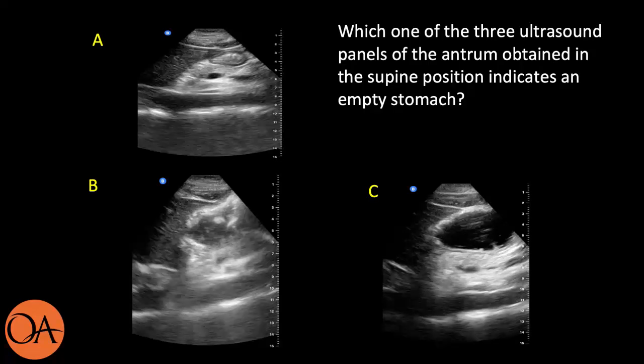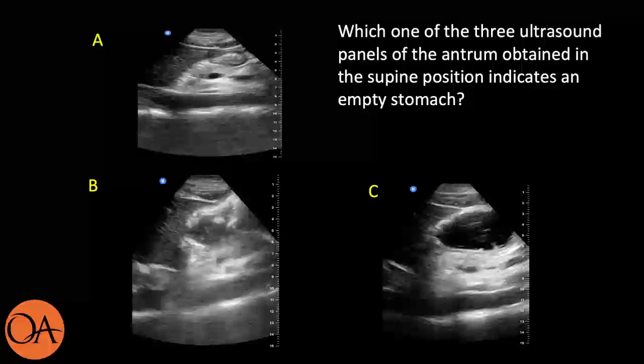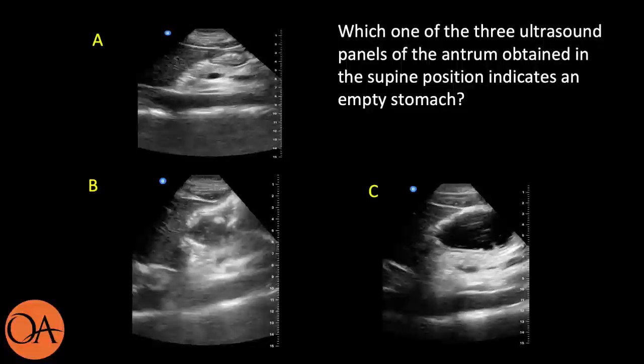gastric antrum at various prandial states by addressing the following question. Of the 3 panels, which panel shows an empty stomach?